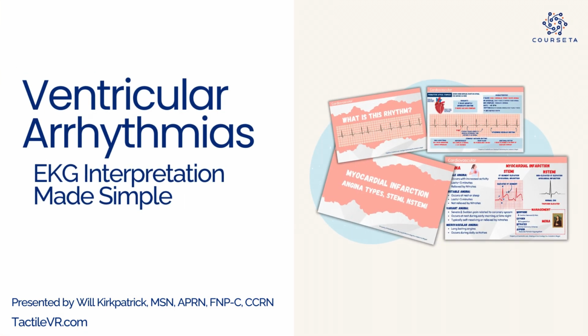How do you know if it's a ventricular arrhythmia right away when you're reading your EKGs? Well, I'm about to show you how now.